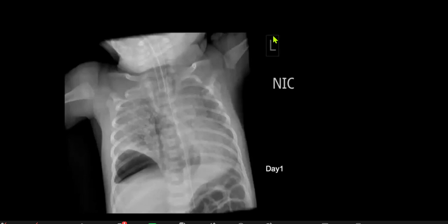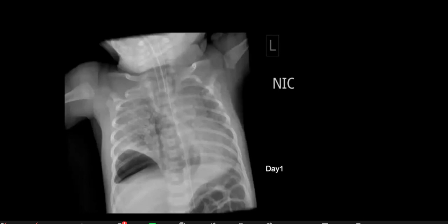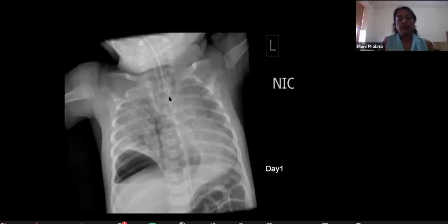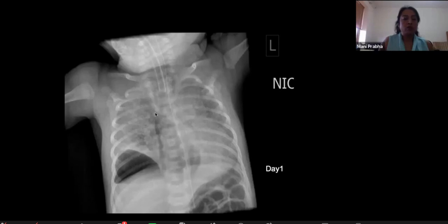if the child's been on ventilation, again, it will be pulmonary interstitial emphysema, will be my differential, as well as, I think he'll be too young for bronchopulmonary dysplasia. The other differential will be meconium aspiration. Okay. Yeah, wonderful. See, there is lucency overlying the mediastinum, and this is mediastinal air. Also it seems to be tracking along the vessels here, and there is a blob of air here, which is likely to be a pneumothorax, an encysted pneumothorax.